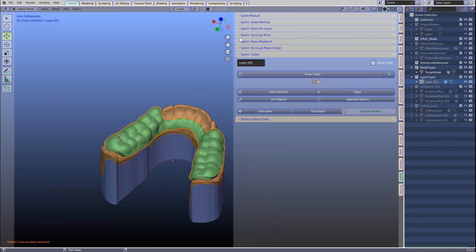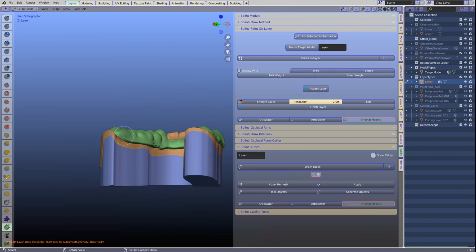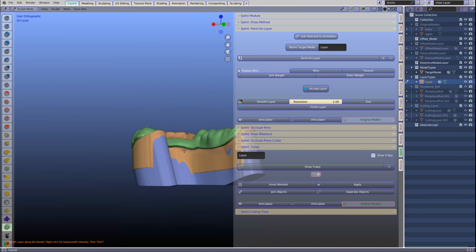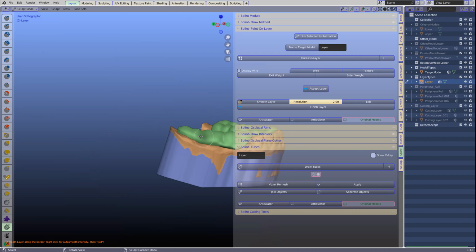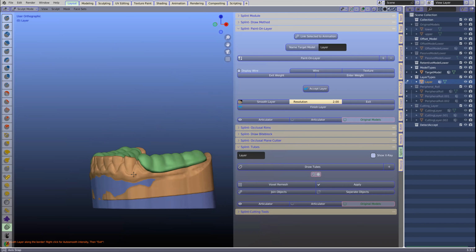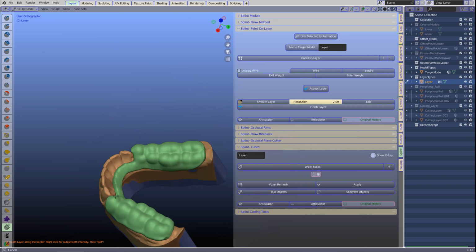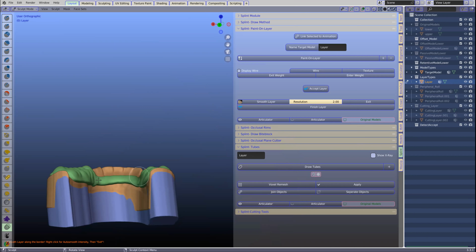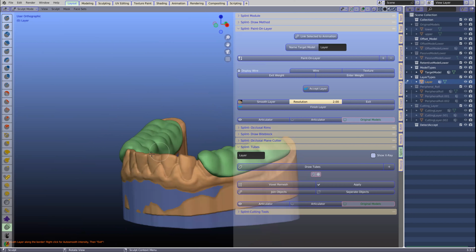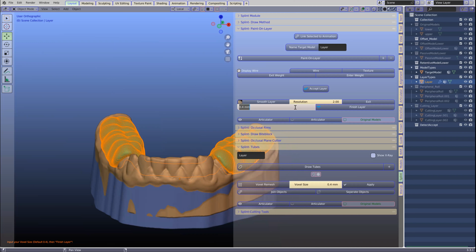Okay, maybe I'll just show you. Okay, yeah, so go back to paint on. You can click on smooth layer. Just give it a nice smoothing. We're always looking at having good quality meshes. Now you may be short somewhere. Okay, so let's just here. You may be in a situation where, okay, let's just exit the smoothing, exit. It gives us another voxel remesh here, and we're going to finish it.